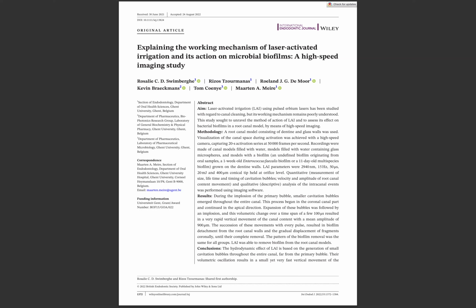Recording and analysis of each experiment lasted for 20 seconds, one activation cycle. High-speed recordings were subjected to quantitative analysis measuring the size, lifespan, and timing of cavitation bubbles, as well as velocity and movement amplitude of the canal content, and qualitative analysis observing bubble dynamics, biofilm detachment pattern, and fluid movement.